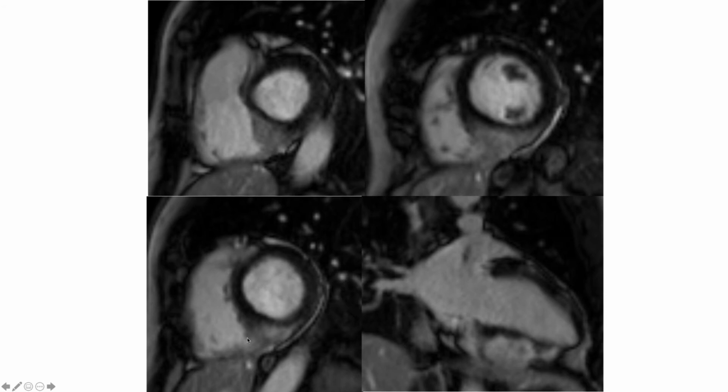Along the other route that we were talking about, this does not look like a classic mass, but maybe some sort of metastatic disease. I'm not entirely sure. Yeah, I think you'd have to consider metastatic disease too from a distant primary. So there was no known primary.